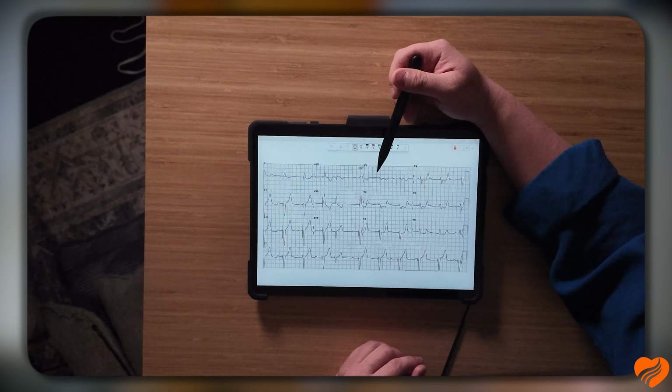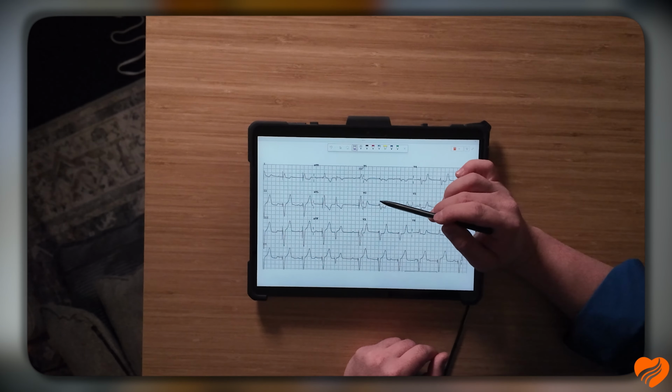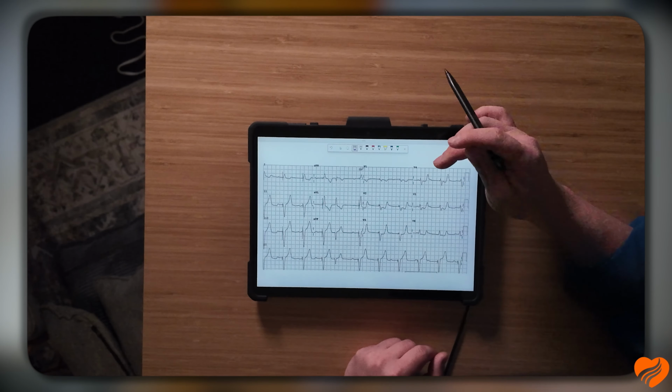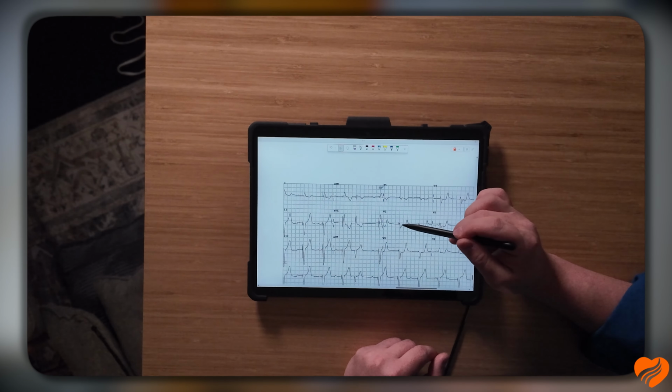This is a good example of discordance right here. See how your QRS is negative, but your T wave is upright? That's discordance. So, looking at lead V2, maybe V3, your QRS, you have your QS right there, leading mostly down, right? And then your J point is below the isoelectric line. So that's concordant ST depression. This patient would be positive as well.